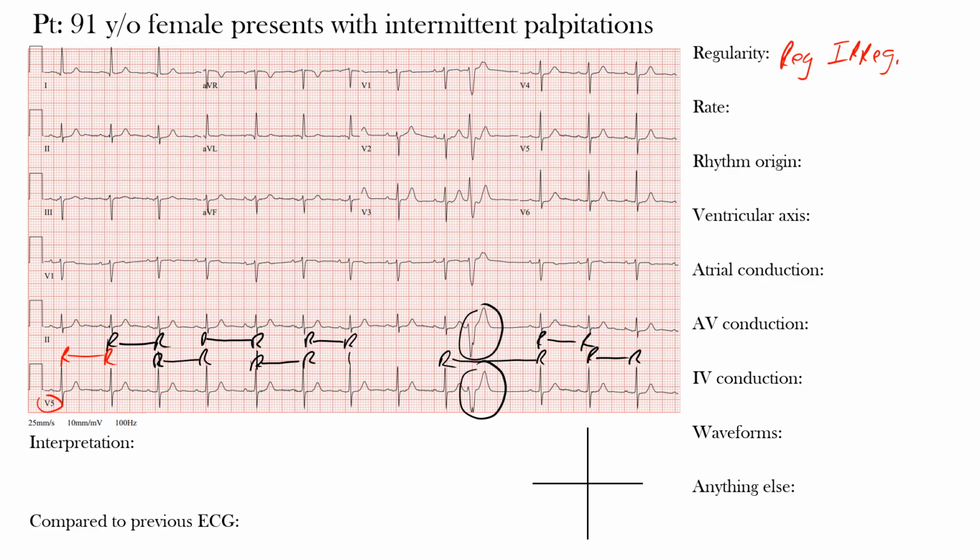So what we'll do is count the number of complexes going across the EKG, multiply that number by 6 to get an estimate of the ventricular rate. And then because we know that the standard EKG represents 10 seconds in total duration, let's go through that now. All right, so I'll erase this so it's cleared up and there's no confusion.